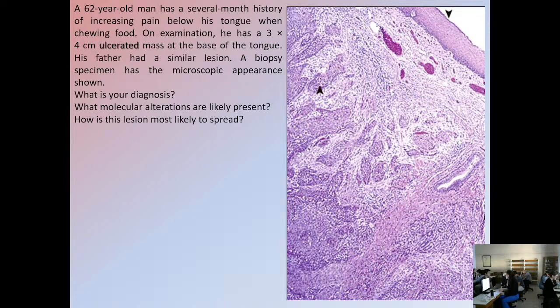Which would be a precursor to invasiveness. Yes, we talked of this lesion in our previous lesson. Dysplasia or in situ carcinoma. These are pre-invasive neoplastic lesions, intraepithelial malignancies, within the lining epithelium. However, this is not the case here because the overlying mucosal epithelium is totally normal. There are no signs of at least high-grade dysplasia.